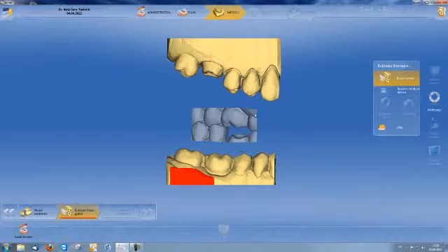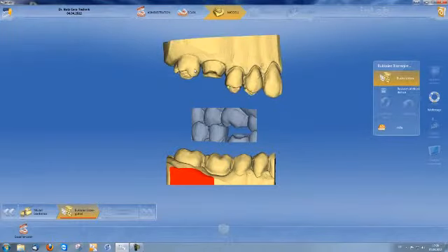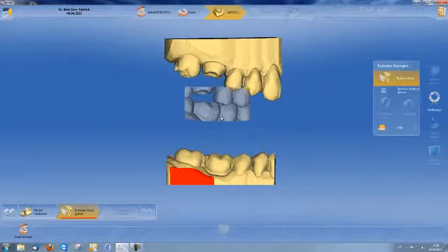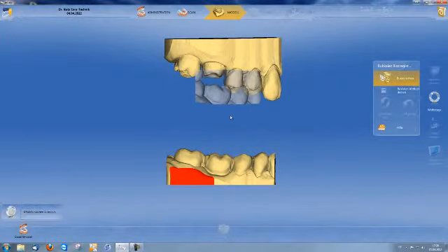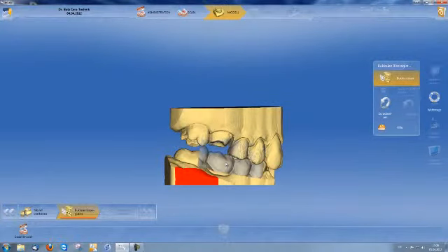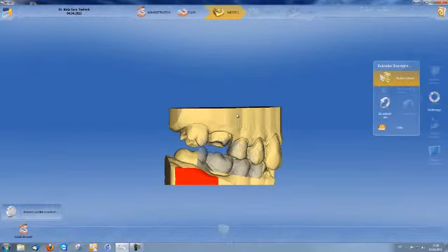After model calculation, I assign the buccal scan. If it is rotated through 180 degrees, I click on the lower half, which serves to automatically rotate it in the direction of the preparation where it is automatically taken into account. The same drag and drop procedure applies for the lower jaw, and the software processes the information automatically.